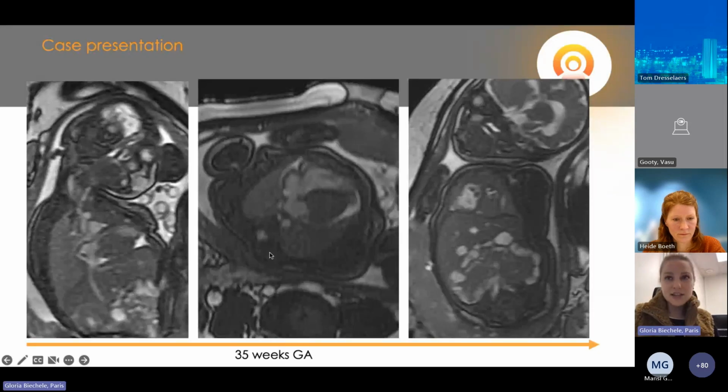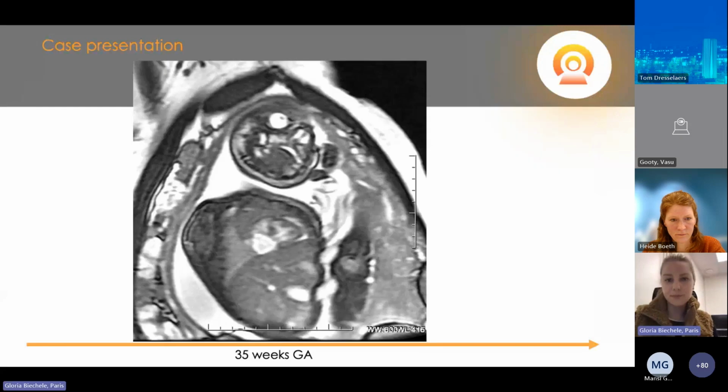First, some static images. Cardiac MRI showed a large left ventricular mass at the basis of the left cavity, which you can see here, here, and here, with a quite homogeneous internal signal positioned analogously to the ultrasound description. So we're going to start. Unfortunately, our PACS stations don't have a microphone nor a camera, so I have some downloaded videos which have a little worse quality than in the PACS, but I hope you can see anyways.